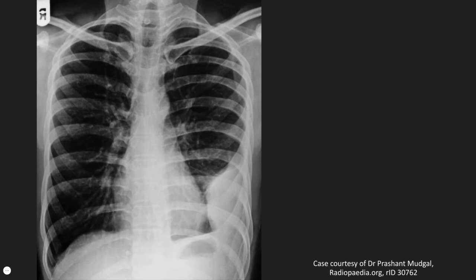This example shows a more unusual left-sided pleural effusion. Here, the fluid hasn't settled into a classic meniscal appearance, but rather has become loculated against the chest wall. Ultrasound and CT can be used to assess whether there are features of underlying empyema and guide intervention.